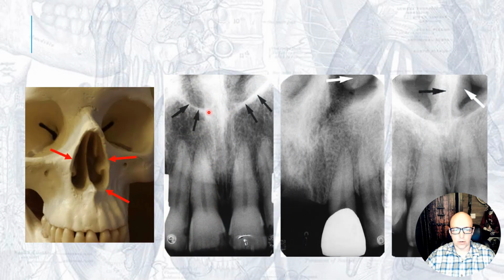So now we're looking at going kind of laterally from the anterior nasal spine, ascending upward. Here the arrow is pointed out in the skull. That makes it kind of apparent, right? And so that's just the opening of the nasal fossa. And this one right here is a different one. We're talking about this. It looks more like a soft tissue structure. And there is soft tissue around it, although there's a bone inside of it. This is the inferior turbinate, or concha.